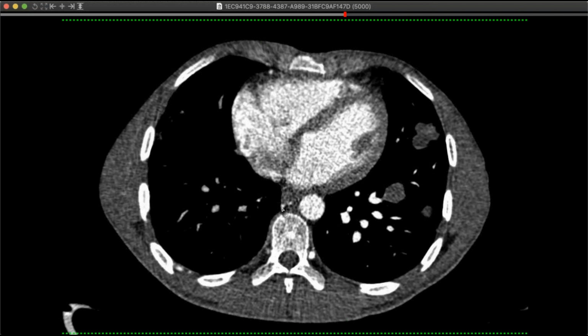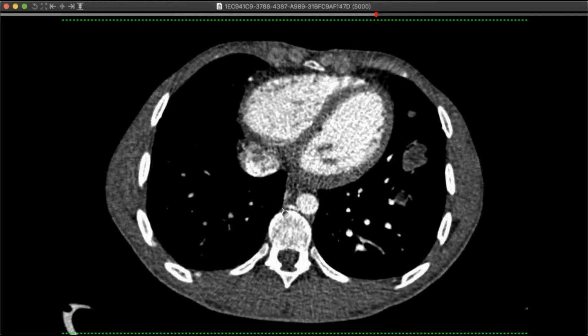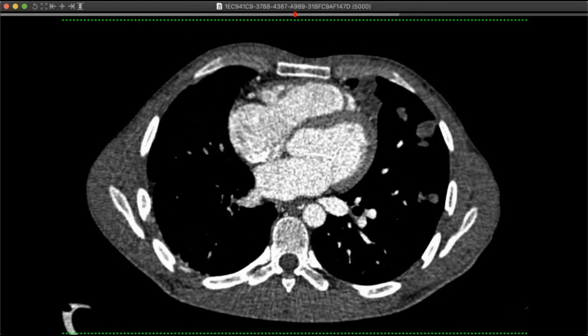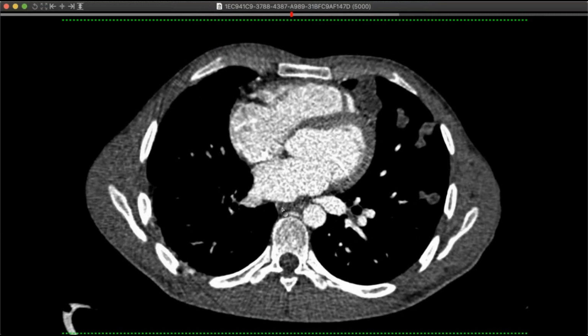Yeah. And I think maybe it was you, Seth, who showed a case of a cyst in the lung that was a hydatid cyst. And people have described liver lesions that have extended into the pleural space or ruptured into the chest. But this is primary, as far as we can tell, there wasn't any liver disease. But this is just multifocal. And the radiologist was telling me that usually it presents as a single lesion in the lung. So this is a very unusual case. I've only seen it with a solitary.